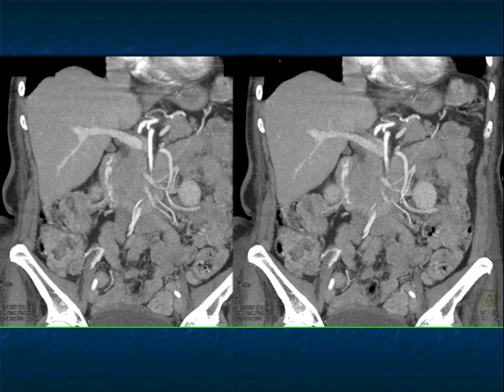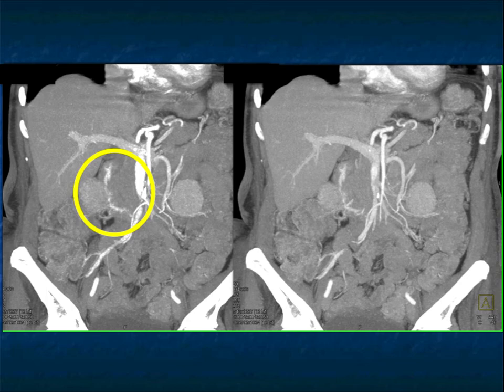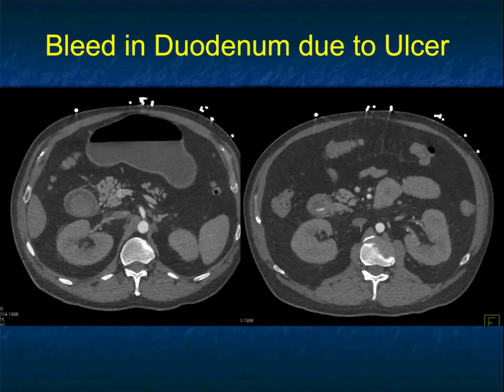So when you look at that, you really realize now you have a GI bleed at the second portion of the duodenum. Where precisely is it coming from? You're going to look carefully, but you know the patient has a very obvious bleed. So just a very nice way of looking at that.